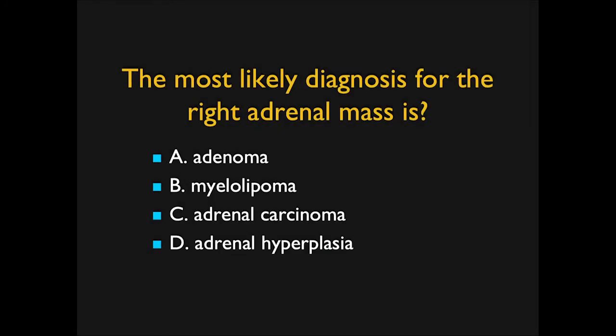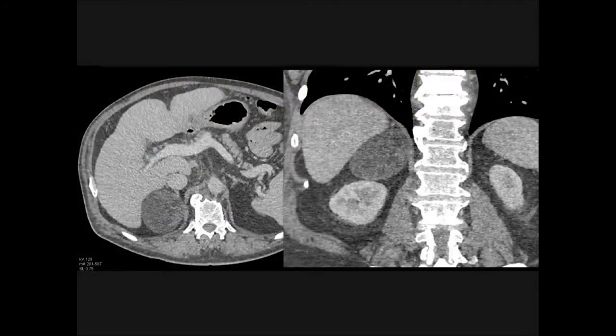This is a simple case, and today I was at an adrenal conference, which is why I showed this case. It wasn't one of the cases from the conference, but we always see these people get very excited about these lesions, and they kind of want to work the patient up.